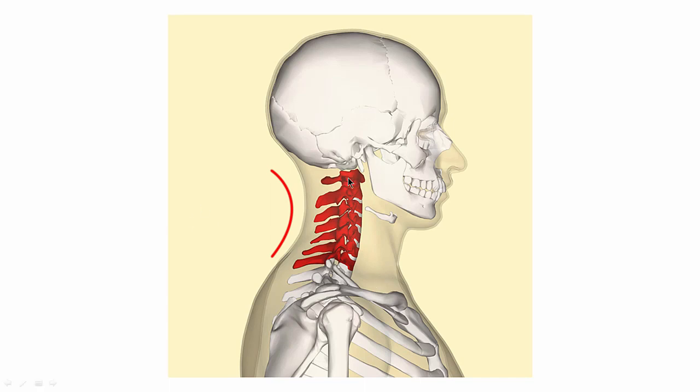Okay, this is obviously your cervical spine. Right here, notice that we have a C-shaped curve, so it has a lordotic curve. Remember, the thoracic spine was kyphotic, lumbar spine was also lordotic. The sacrum also has a kyphotic curve. There are 7 bones in the cervical spine. You have the atlas or C1, axis or C2, C3, C4, C5, C6, and C7.